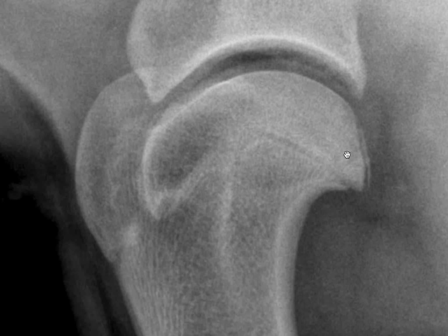You will also notice a linear mineral opacity here. And if you look closely, this is very subtle, but the humeral head in this part is slightly more heterogeneous than in other areas, like for example here. So what we have here is a very nice example of osteochondritis dissecans, which is the progression of osteochondrosis. And osteochondrosis is an anomaly in the formation of the subchondral bone and cartilage, which very often in dogs will occur in this area here.